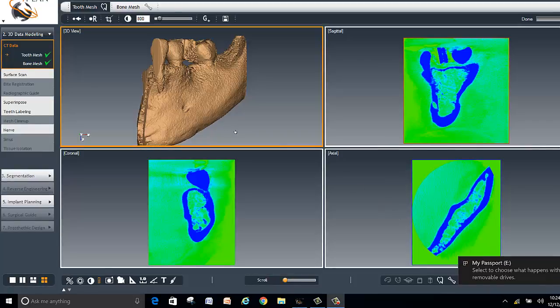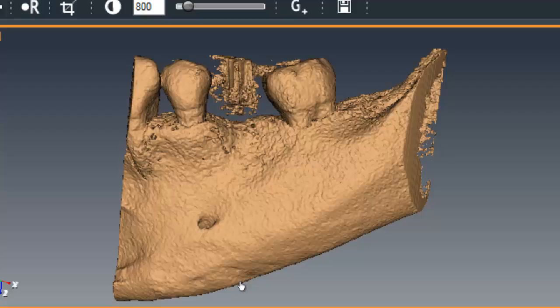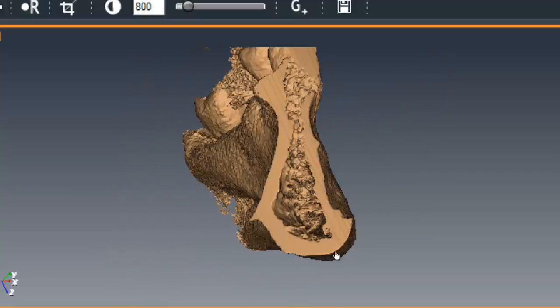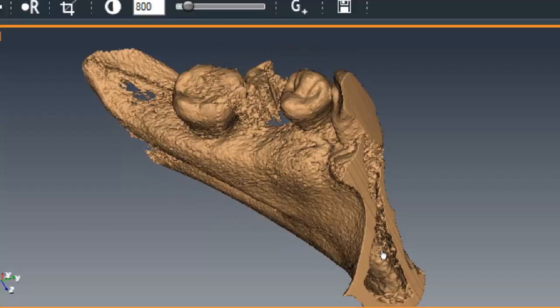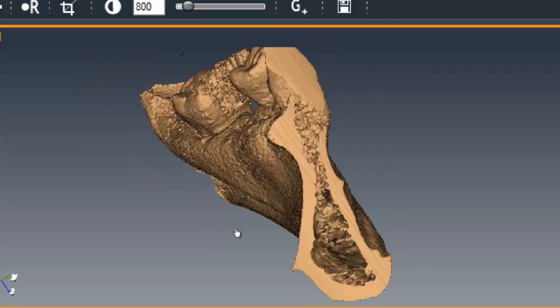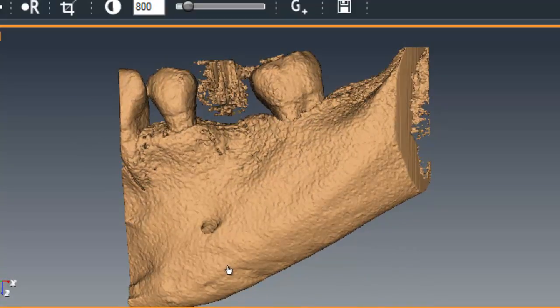This is the treatment plan for a lower tooth number 19 mandibular case, single unit implant. This patient was scanned and a partial scan was sent. It is not recommended that we send a partial scan simply because it's very difficult to merge the data. Then you'd have to go in and merge the data manually in order to set the load vector analysis and the placement of the implant in the right position. Anyway, the technicians went ahead and made sure they merged the data manually. Of course, that takes quite a bit longer and it's very, very time consuming.